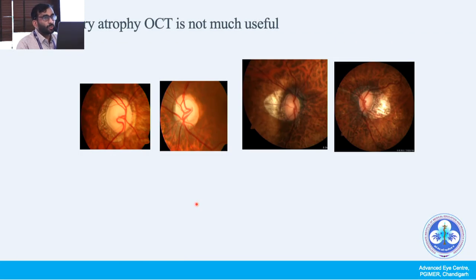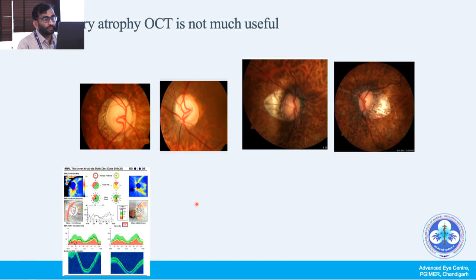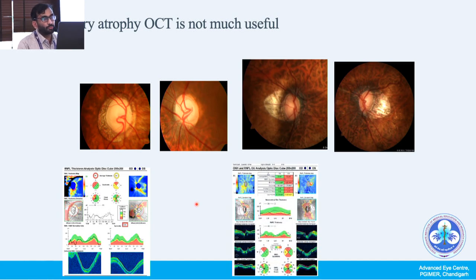As already mentioned, in peripapillary atrophy the OCT may not be very useful because you will get all kinds of funny pictures, like poor segmentation, and weird thickness that may be very high or very low. So in peripapillary atrophy, you follow the optic disc contour and optic disc changes periodically and correlate clinically, and OCT is not much use.